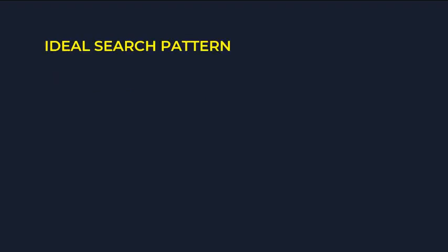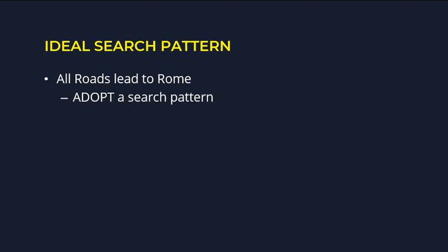So what's the ideal search pattern? In fact, there is none. You will be reviewing with multiple faculty, each of whom has their own search pattern. The most important thing is to have a search pattern, and with time you can modify it and make it better fit your level of expertise.